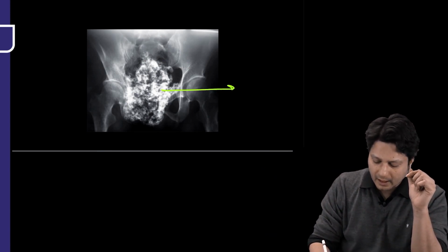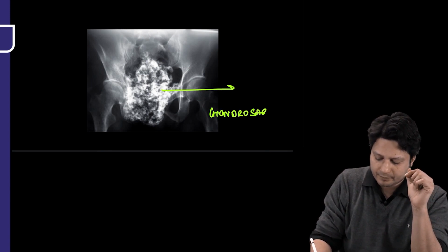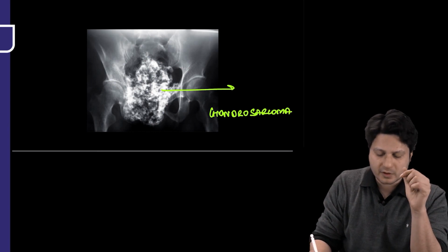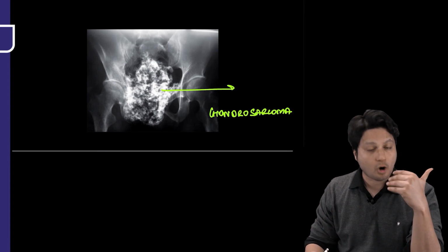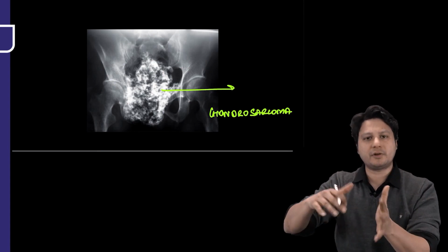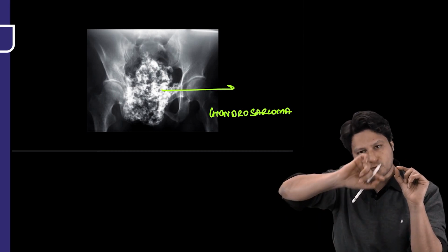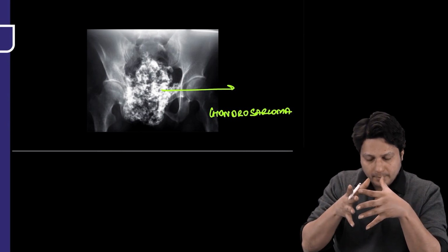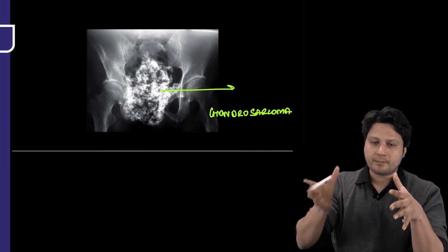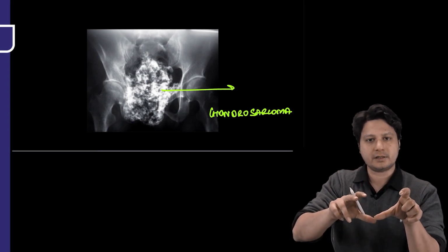The name of a malignant cartilaginous tumor is chondrosarcoma. And this is what you have written, that the chondrosarcomatous appearance is an inhomogeneous kind of calcification, C-shaped calcification, comma-shaped calcification. These are the different synonyms which are provided. But the essence is that whenever you see this irregularly patterned calcification beyond the confines of a normal bone, you assume it to be originating from a cartilaginous tumor.